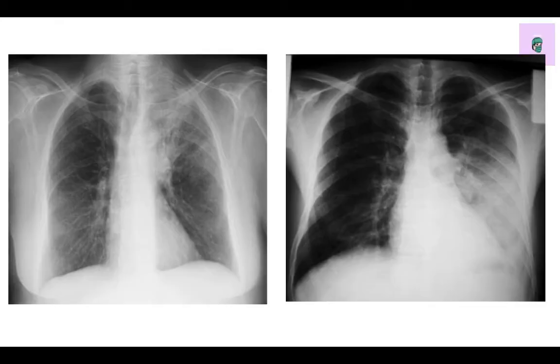Okay, next, these I haven't given above what it is, so you can use your active brain right now, because once it's written upside, then we tend to go by it. So let's practice it. You can see the left side, right border, correct? Right, everything is visible. Right dome, visible. Okay, never mind. Let's go from down. Hemidiaphragm, visible, correct?